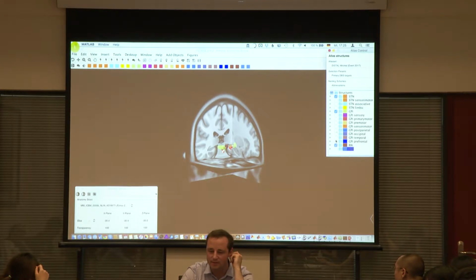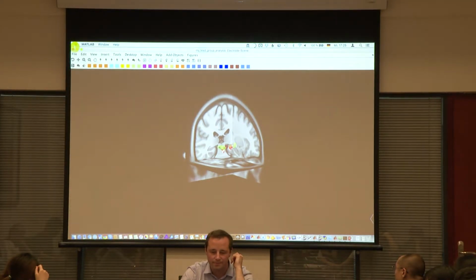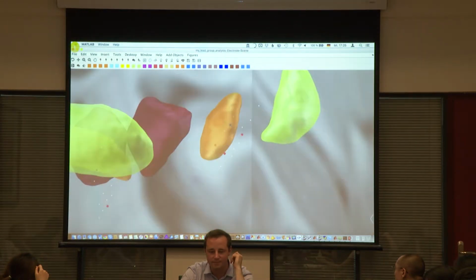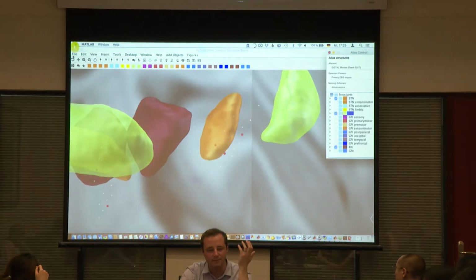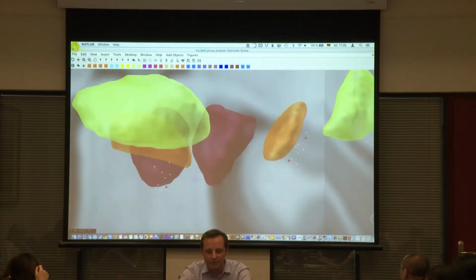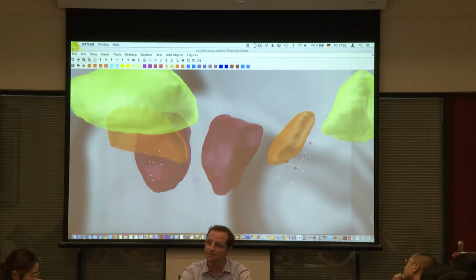And maybe let's zoom in here. Right, so to make pictures like that, if you have some 100 electrodes, it makes much more sense to just show point clouds, and sometimes it only makes sense to only show the active contacts, right? Because that's actually where in the brain you did stimulate.